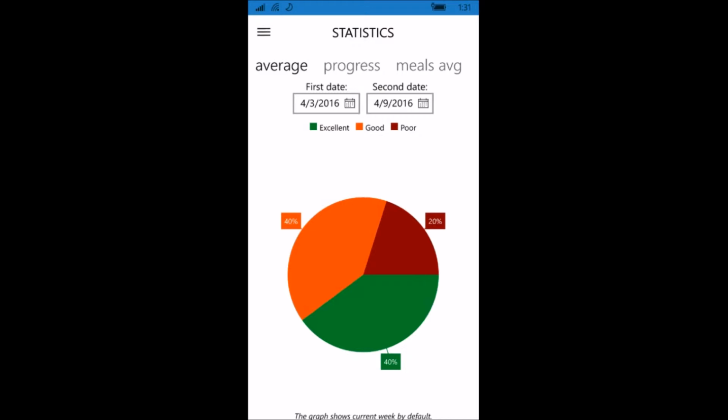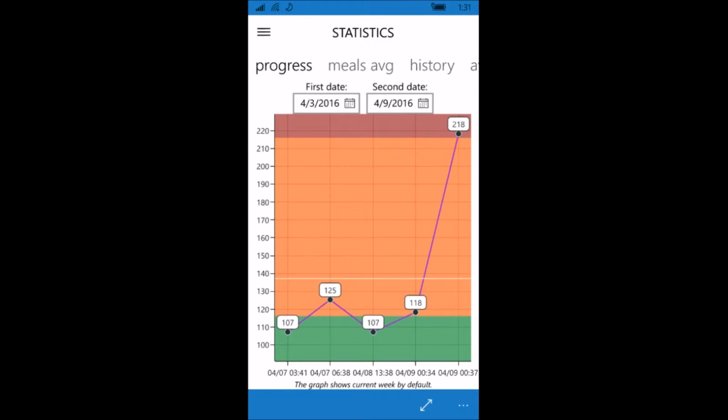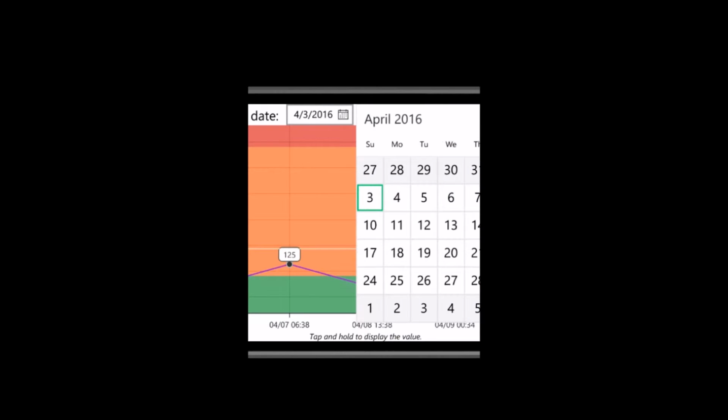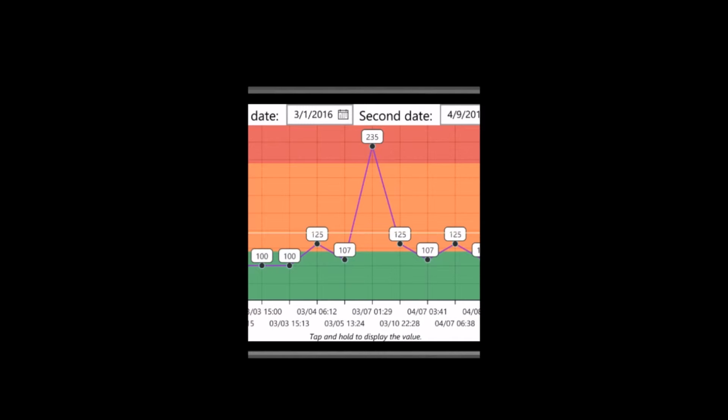The first one is the average. That is something that is per week or per month or whatever information. The progress has even a yellow line that you can see very shortly. This line is your weekly challenge if you assign it. That is going to help people to understand effectively if they are on the right path or they are doing something wrong. As you can see there now, there is a red line that seems to be something not so good. Sorry because this doesn't look exactly very well, this part, but you could check it later in the application.